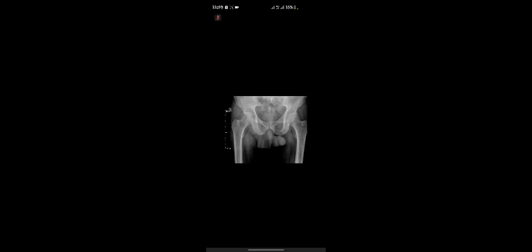Just looking at the adjacent cortex, there's possible increase. So actually what I was perceiving as lucency on the left could be sclerosis on the right. I'm seeing thickening of the iliopectineal line. Can you please point out if your mouse function is working? So yeah, excellent. So you've picked up something, and with that, where is the soft tissue? The asymmetry. Okay, very good. What will you do next? I would need to evaluate, preferably with MR, if resources would allow.